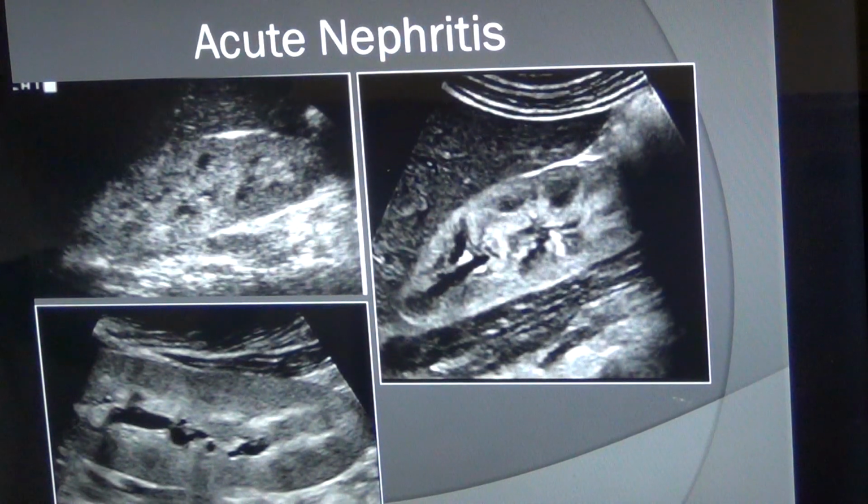Okay, so this is a diagnostic feature in acute glomerulonephritis, also known as Bright's disease. In Bright's disease, the kidney will be brighter and the medullary pyramids will stand out, more prominent. There will be hypervascularity, blood vessels are visible, and you will see a collection of fluid inside the sinus, and the cortex gets brighter and thicker.